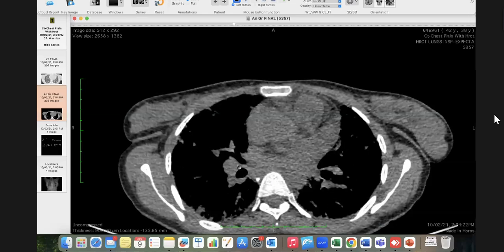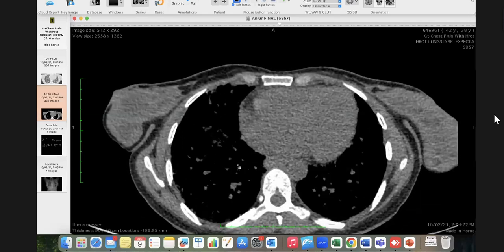So you see, whenever you see this disease, which is more marked in the upper lobes than the lower lobes, and it's a confusing spectrum of fibrosing lung disease, parenchymal fibrosis, lots of lymphadenopathy, and maybe nodules, then you are sure you are dealing with sarcoidosis. Sarcoidosis is a great masquerader. I'm telling you, always keep it in mind. It could present as a consolidative disease, it could present as an ILD, it could present as a nodular disease, or a combination of all these. So, this was a classic sarcoid, which was very advanced.